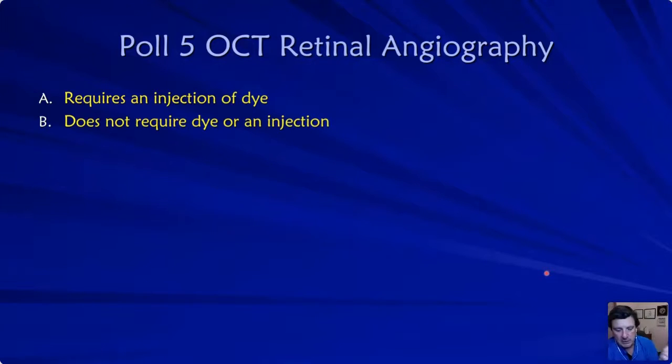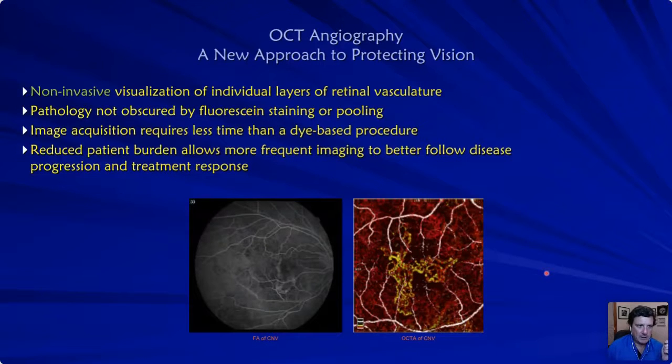That is correct. So OCT retinal angiography, you're going to see some really cool images here. It's kind of a new approach. It's non-invasive, again, not needing a dye. And the reason I keep bringing this up is I can't tell you how many times we do a live event, and I go through a whole hour lecture, 2 hours, on how to interpret this. And that's why I like hanging out by the coffee machine or down at the bar at night, and people come up and go, hey, what type of dye are they using for that? And I go, there's no dye.